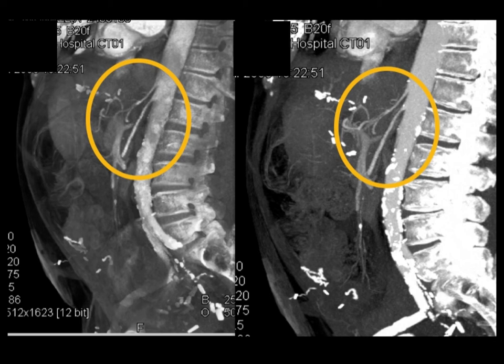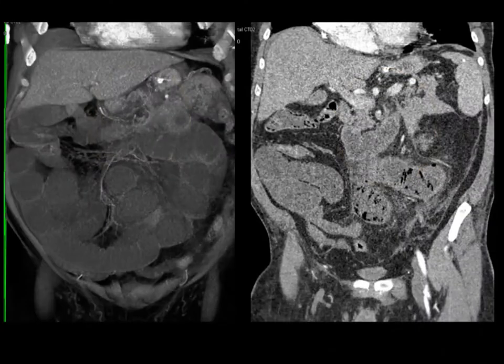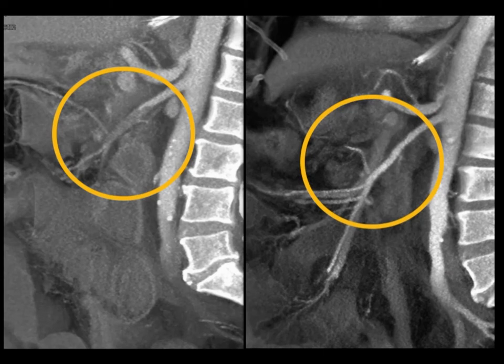This case is very important because look at the proximal aspect of the patient's SMA and celiac. There's no calcified plaque present. There's no calcified plaque in the vessels, yet there's ischemia present because there's occlusion of the vessels. And here's another example. The SMA looks perfect, but at about a couple centimeters in, it's occluded and the bowel is ischemic. So you want to be very careful.